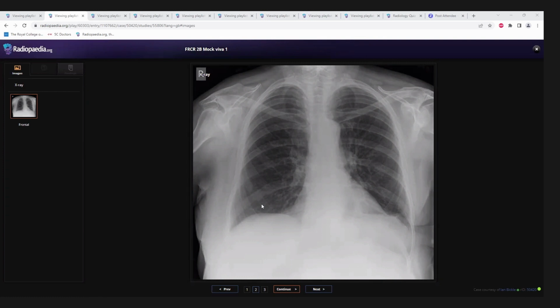All right. Which is the most common primary that you're suspecting in this case, given the gender? I think this is a female. I can see breast shadow. So if the patient is known to have a primary breast cancer, this is most likely a metastatic deposit.